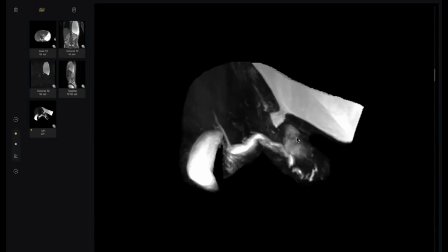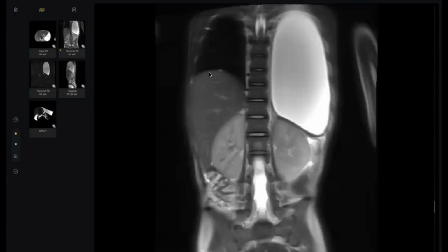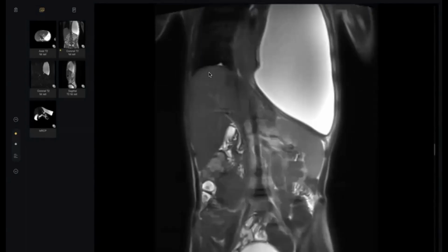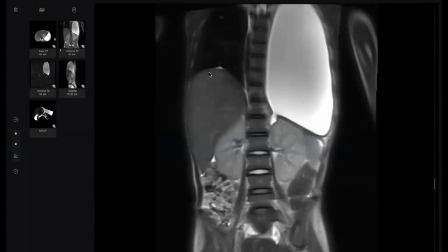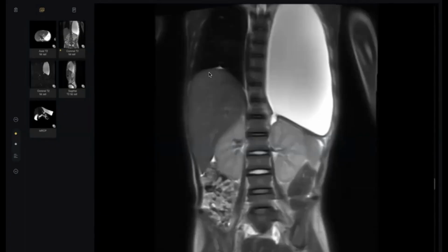This is a collection. Pseudocyst. And there is a connection between the effusion and the pseudocyst of the pancreas. See, the pseudocyst is connected by the duct. So this is recurrent pleural effusion due to pseudocyst formation from chronic pancreatitis. But there is still a missing part. There is a pancreatico-pleural fistula.